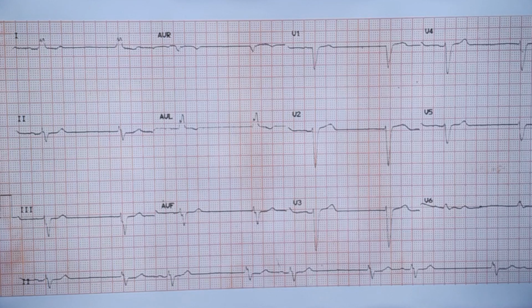Now we will look at the cause of the group beating. If you look at this QRS, there is no preceding P wave. With such a long interval before that, there is no preceding P wave, while this QRS has a P wave. So in the setting of severe bradycardia, when you have a QRS without a P wave, we call it an escape beat. With a wide QRS, you might think that is a ventricular escape beat.